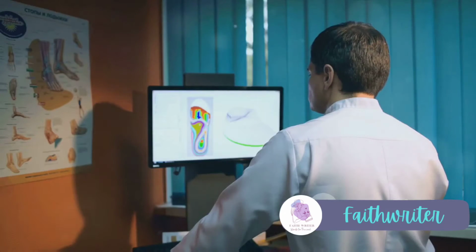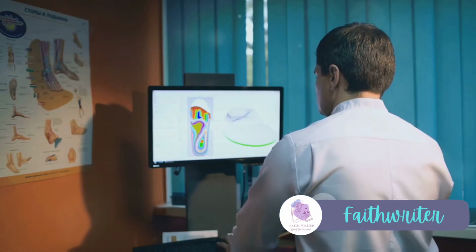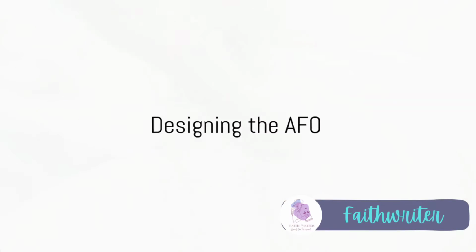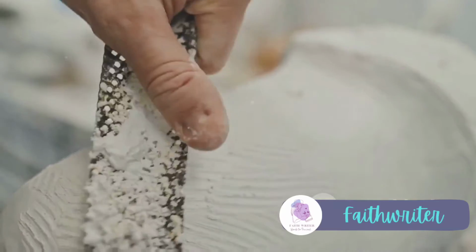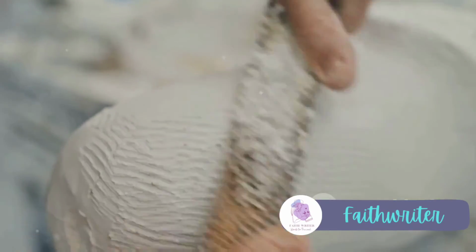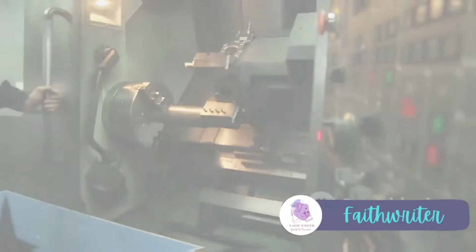However, as technology evolves, alternative methods such as 3D scanning and computer-aided design, or CAD, are increasingly used to create a digital model. Using the mold or the digital model, the orthotist or manufacturer designs the AFO to meet the specific needs of the patient. The design process takes into account the condition being treated and the patient's activity level. With the design finalized, it's time to bring the AFO to life.